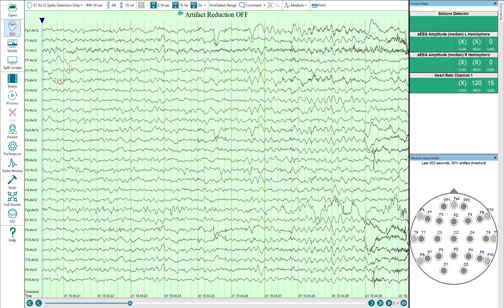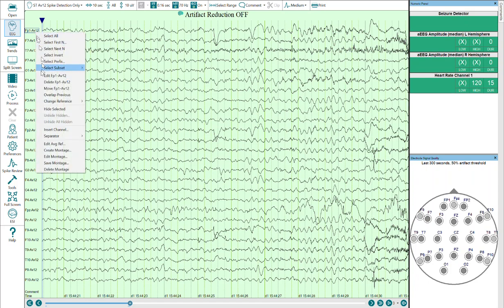Now let's say we want to create a montage by creating it from scratch. I can right click on this, and I'm going to go ahead and do create montage.